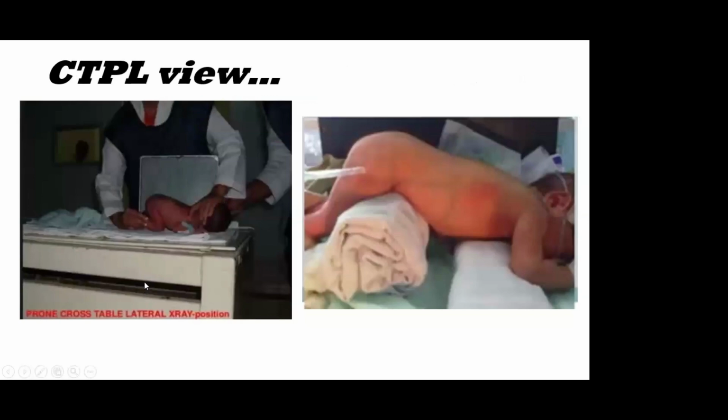Another view is the CTPL view, that is called cross table prone lateral. So cross table is across the table. We keep the baby prone and we take a lateral X-ray, same as how we have taken the cross table supine X-ray, but this is the prone. Mainly it is being done for anorectal malformations.